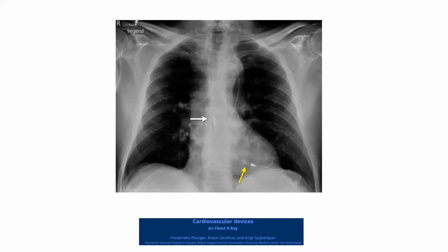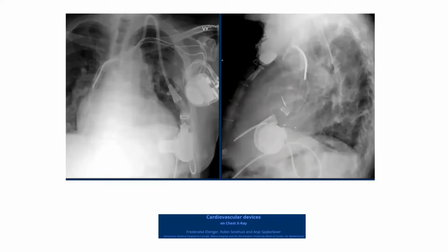No, you see, LVAD is something external. Because you know the cannula is inserted into the LV and it has an outer part with another cannula that goes into the proximal aorta.